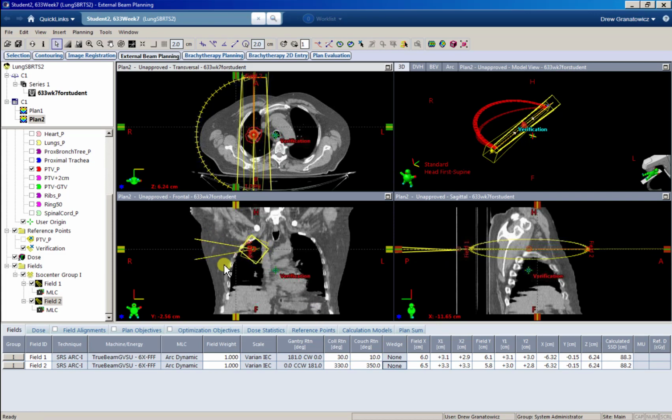We're trying to spread out our low dose so that we can get really, really tight isodose lines of our higher dose areas, right? Remember, we're treating 1000 centigray a day, which is much higher than we normally are. We want to treat basically as little of the body as we can with that high dose. We want it really focused on just our target. If we kick the couch, we're now entering on 2 different planes, and it's going to help spread that dose out. We're going to have really good control over our high dose areas. So I always try to kick the couch if I think I can.